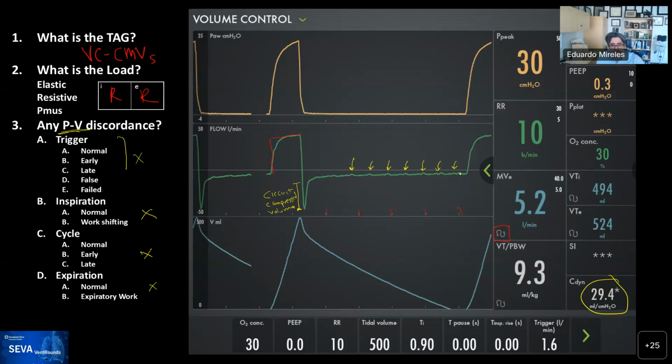Right. And there's a question here about whether the waveform of expiratory flow with a high resistive load like this one changes based on the level of the obstruction, small airways versus large airways. Rob, any comments there? As far as I know, you can't distinguish it. Yeah, it would be hard for me to figure out a difference between them, because when you do the resistance times the compliance in the time constant, you're talking about the average of all the resistances in the system, correct? That's right. The equation of motion just assumes that you have one lumped resistance that represents all the airways, including the artificial airway.